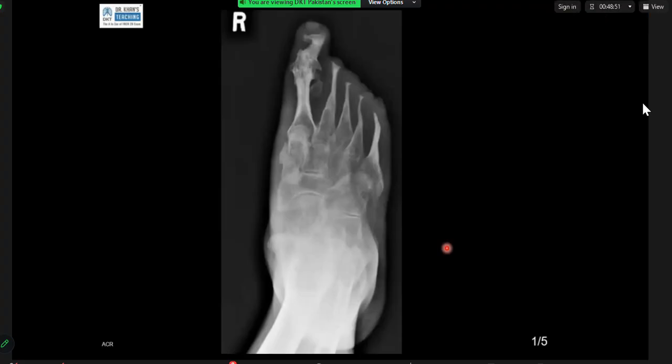No, sir, there's increased density. There are patchy areas of sclerosis, and there's bony destruction, and there's licked candy appearance of the second to fifth toes, with soft tissue swelling.